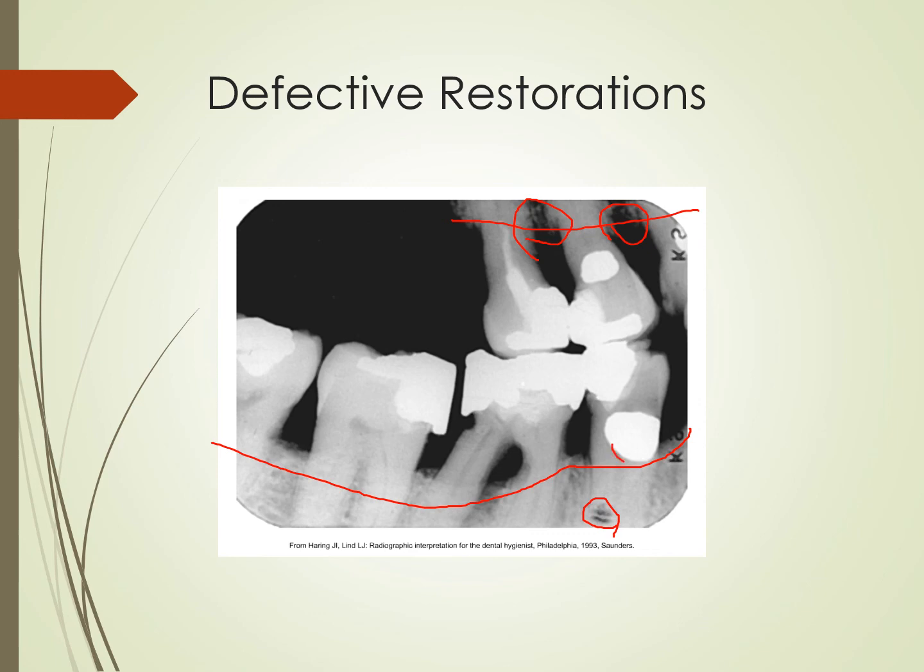There's some root cavities here. That's what this one looks like, and that's also what this one looks like. And the patient has a root canal and a post and core here. Actually, let me get rid of the little line I just drew. Remember we talked about how there's gutta percha on this section, and then there's the post and core here, and they don't even have a crown on this tooth. This is just a really big filling here.